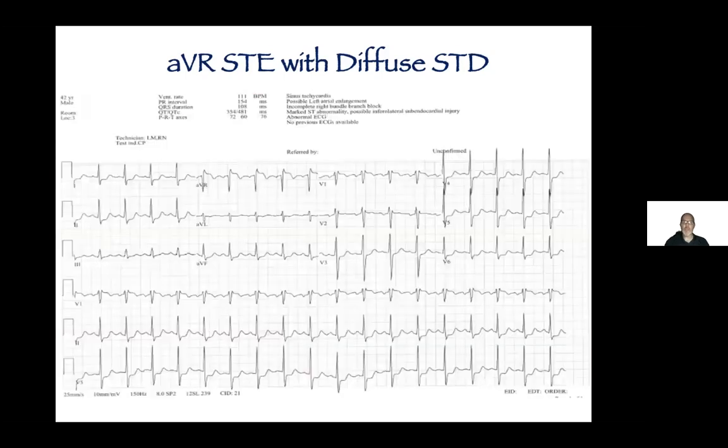Here's another example. It's a 42-year-old firefighter that came into the emergency department where my wife works as a nurse. She provided this EKG to me. You can see elevation up here in lead aVR and all of these different leads where there's ST segment depression. At 42 years of age, this guy was diagnosed with triple vessel disease and got a triple bypass. And he weighed about 165 pounds and was a perfect picture of health. You can't get past bad genetics.